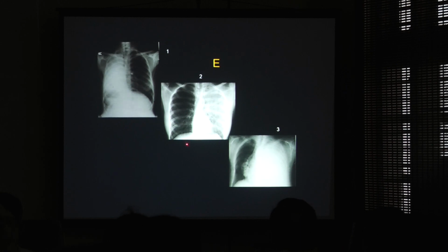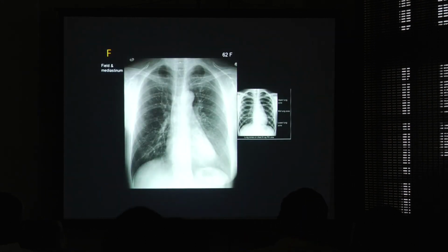Coming to this case, there is no mediastinal shift. And also if you look carefully, you can see linear air containing structures. These are the air bronchogram, the air within the bronchi, which are well seen because of the opacity. So if you see air bronchogram, that tells you that you are dealing with consolidation and no mediastinal shift. There is no volume loss. Coming here, the opaque hemithorax with mediastinal shift, that is a case of pleural effusion.